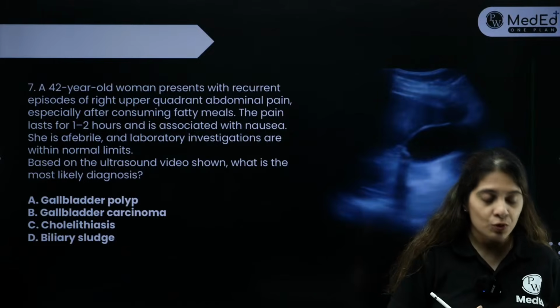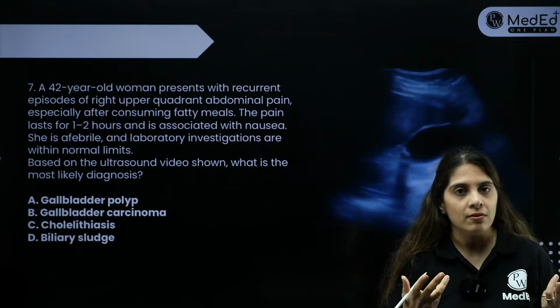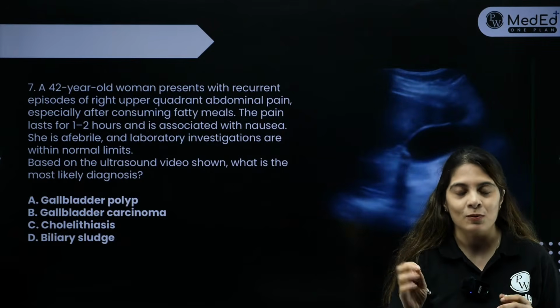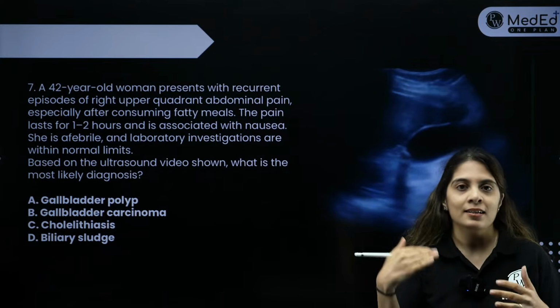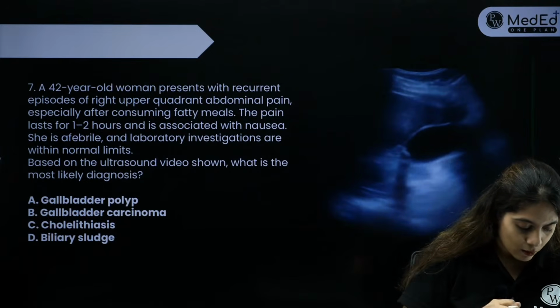Okay, now let's move towards our seventh question. Again an ultrasound. I have shown you a lot of ultrasound images because I feel that if they test you in radiology video-based questions, it will mostly be either an ultrasound or a Doppler image rather than a scrollable CT or MRI image, right? So let us see the question first.